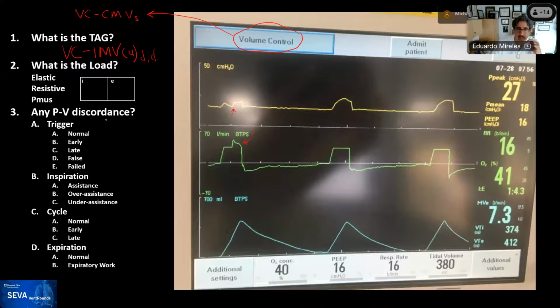Yeah, so we're starting to see some of the members recognize the presence of PMUS during inspiration, and then during expiration, the word that comes is resistance. Okay, so that's what's coming, and I get a little happy face. So let's analyze this for a second. And so we recognize that there is evidence of PMUS here.